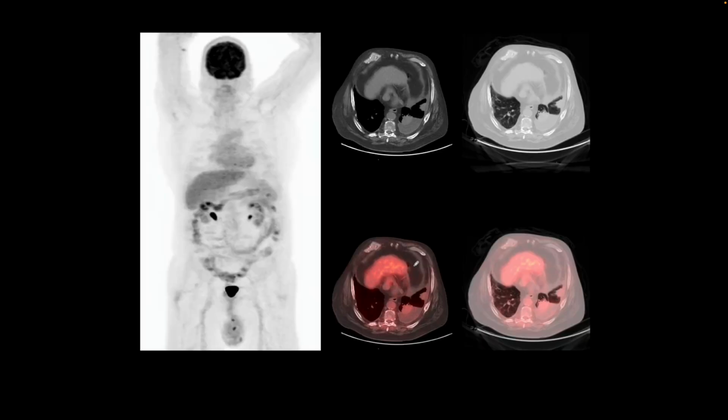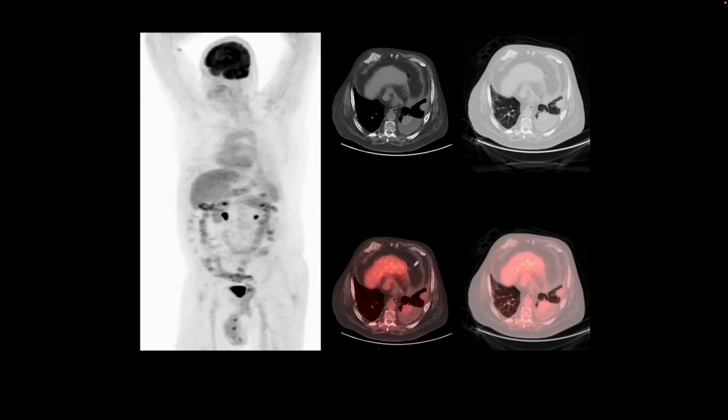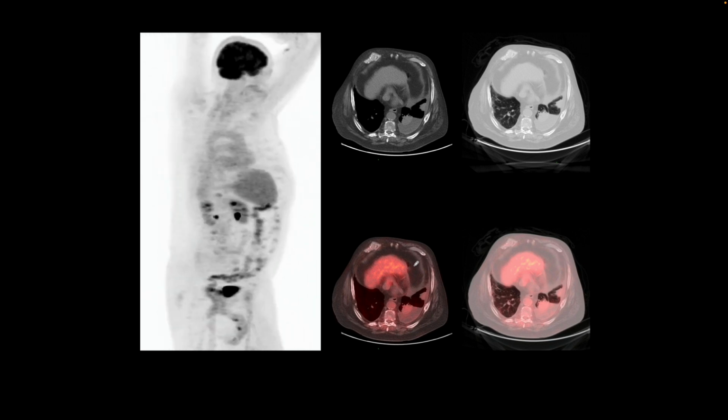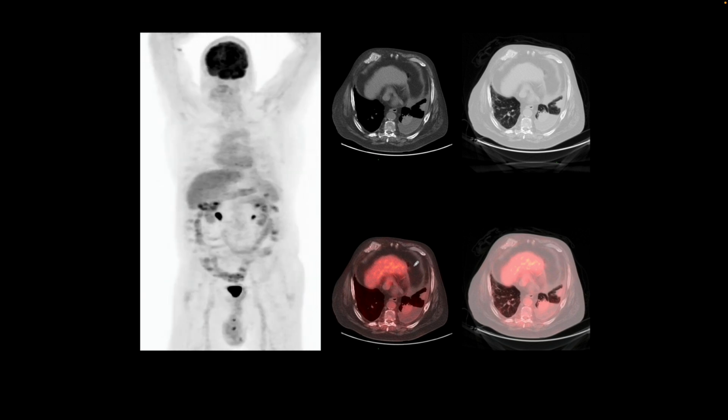This is our next patient, and they underwent a FDG PET CT scan for a suspected tumor or cancer in the left lower lobe of the lung. So let's start by looking at the rotating image. We find that there is physiologic distribution of the tracer, with the brain being most intense, then liver, and then the spleen shows mild uptake, variable uptake in the bowel loops, excretion from the kidneys into the bladder. And we don't see any focal hypermetabolism to suggest active neoplastic disease.